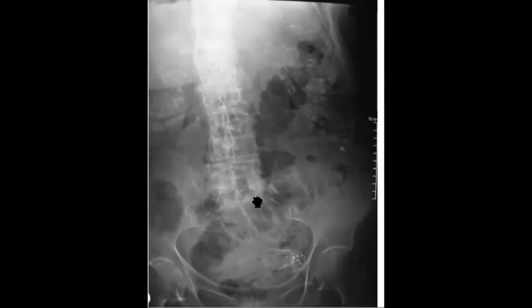So maybe your first imagination is that this patient has some adhesions. Maybe he had surgery and has post-surgical adhesions, and maybe this is from the adhesions. And maybe this is another stent related to the rectum or whatever, to clarify more of the history and the clinical data.